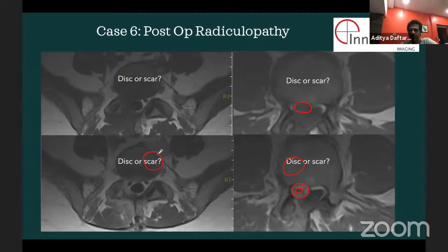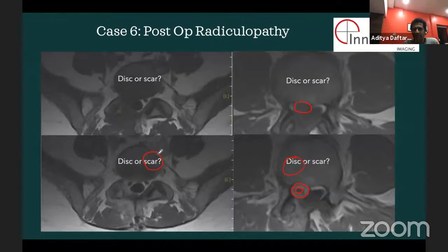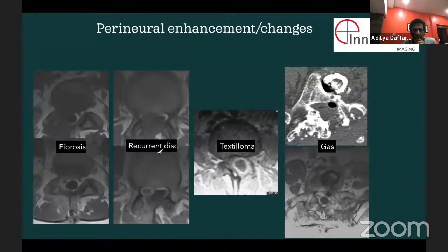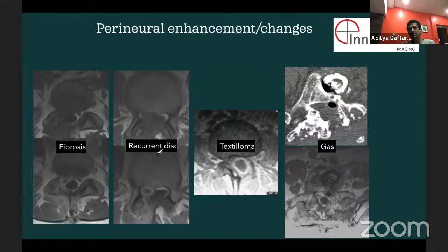Okay, so everyone clear about this? Any questions? All of the cases are not necessarily this clean, but this is sort of a way to really establish it very clearly. Also remember, it will not be purely isolated and black and white. There are going to be those gray zones. You may see it better on the axial, sometimes on the coronal, sometimes on the sagittal. So we do get post-contrast images in multiple planes because it really helps us with what is going on.